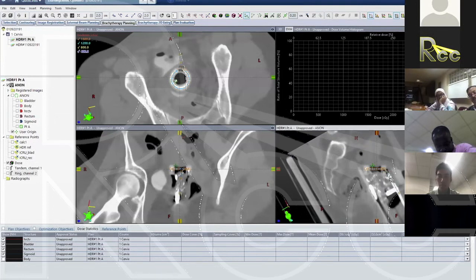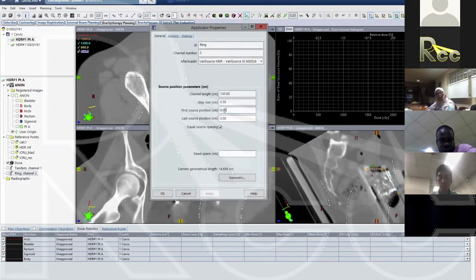We're not going to load anywhere up here, but we should digitize more than we have. As Derek mentioned, go through and look at our axial, coronal, and sagittal slices, make sure we're very happy with our digitization, and then we could add our dwell positions as well.